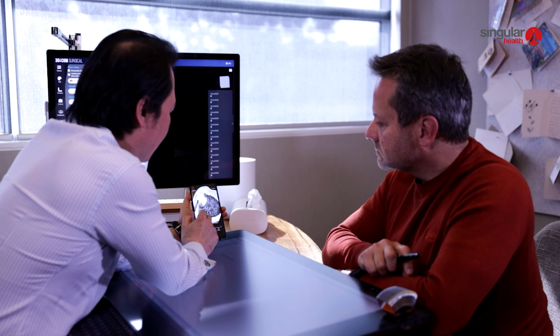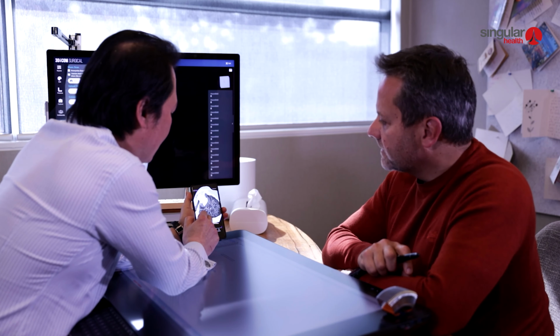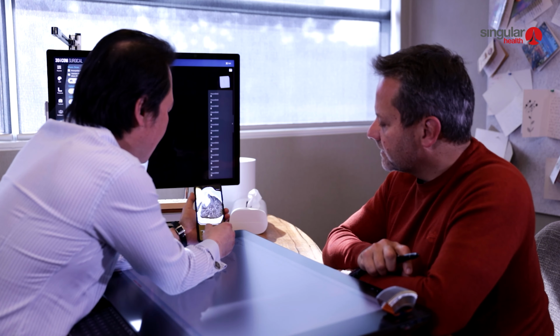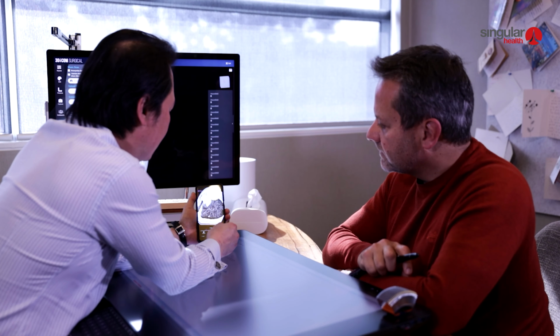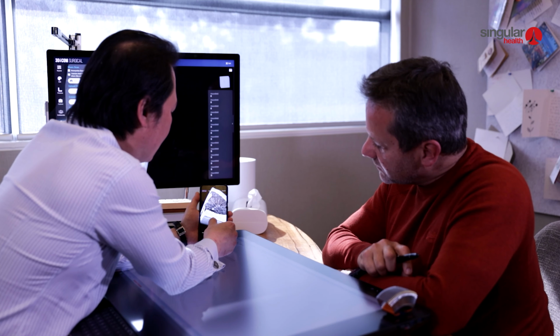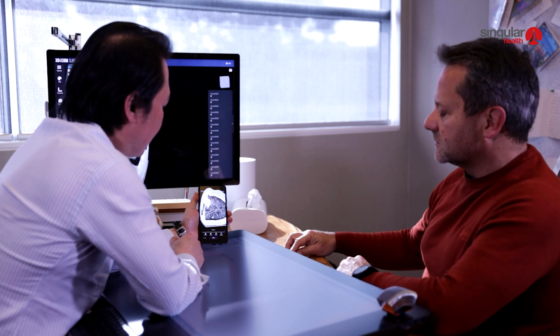The radiologist will decide and orientate themselves to see how they'll approach this. But I think this would probably be the route they go through, because this is the shortest distance to get to it, and it's between the two ribs there. I see. They'll make a decision, and the interventional radiologists are all very good at doing that. They'll be able to appreciate that quite easily. Perhaps you can appreciate it a little bit better on this 3D rather than the 2D scan.